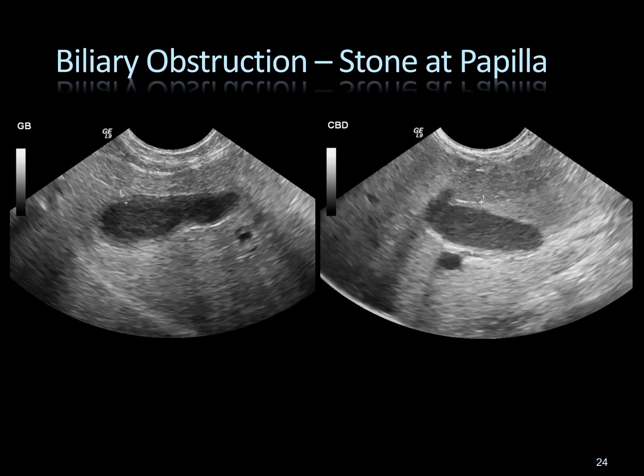It wasn't particularly exciting. What's more interesting is on the right-hand image, that structure looks just as big as the gallbladder. That's actually the common bile duct. I didn't give you the measurement, but even to eyeball it, it is quite enlarged. I think this one was a centimeter plus. Certainly you'd want to see that number to know for sure how big it was, but this was greatly enlarged and compatible with an obstruction.